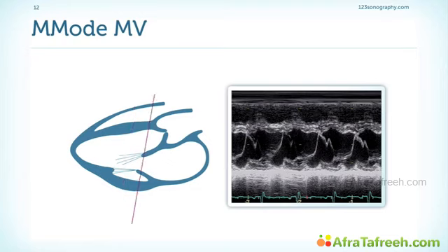The M mode of the mitral valve has lost much of its importance. Previously, this technique was used to even quantify the degree of mitral stenosis, but nowadays, in the age of 2D echo, this is not very important.